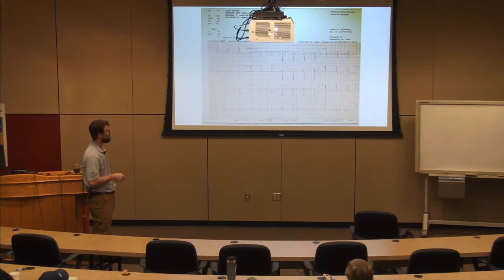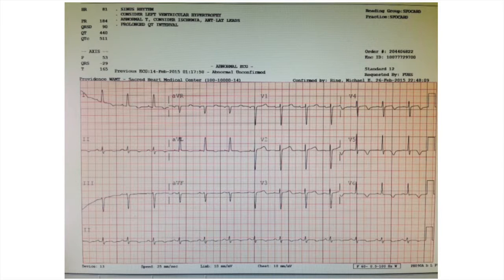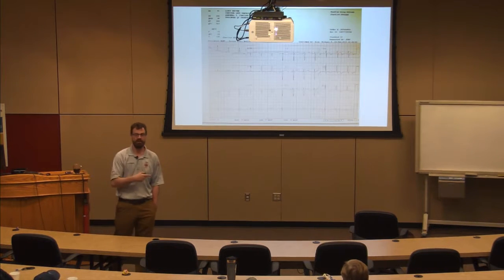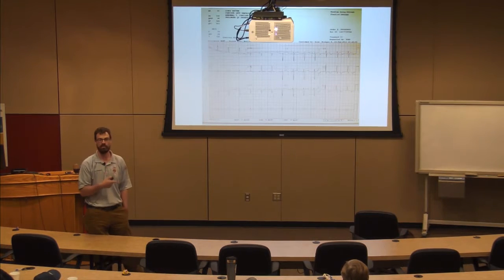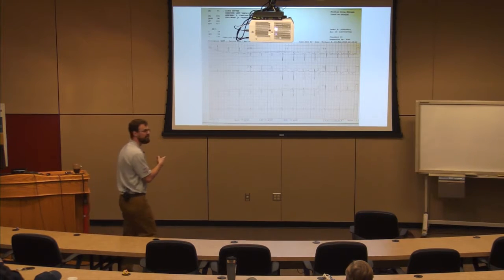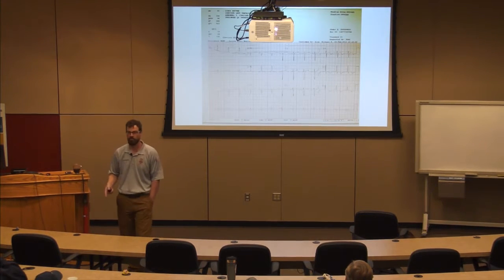And if you look at her baseline EKG, I have a QT interval here to here, which you could argue is more than half of the RR interval, particularly when you look at it out here. But when I see my QT corrected, it's 511. I'm not saying that you have to diagnose the torsades before it happens on the little old lady with cold and flu symptoms who's on azithromycin. That's not my point. But here's an example of somebody who just took a bunch of something.